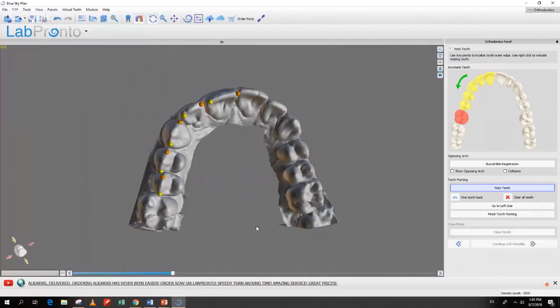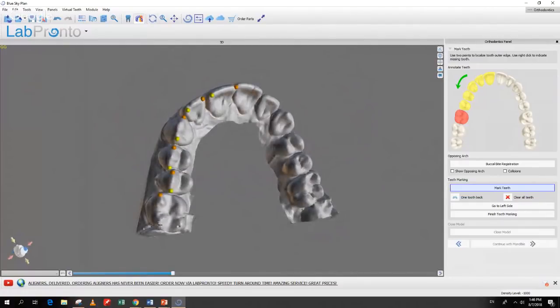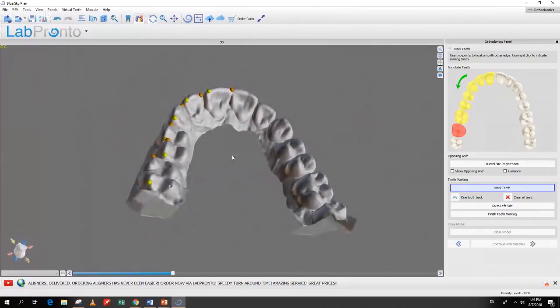It also helps with the segmentation, automatic segmentation of the teeth, which the software is going to propose. So it's important for that as well. In addition, it's also important for the snap to curve functionality, which we're going to see a bit later. So you do want to properly place these points. It gets everything working better and more efficiently in the software.